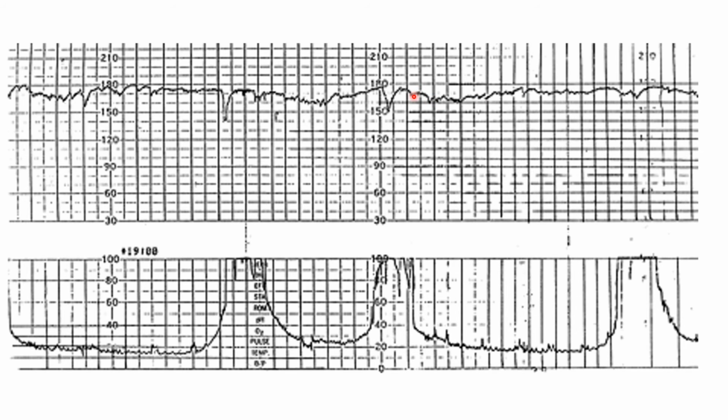In addition to that, some variable but mild decelerations are also present. So for example, here, you would not call this a deceleration, but here, this is the start of the uterine contraction, but this is appearing later and then going back up. And here too, there's a shallow and slightly variable deceleration present here. But this one is more marked, and this one is slightly more marked, but this one is very shallow.